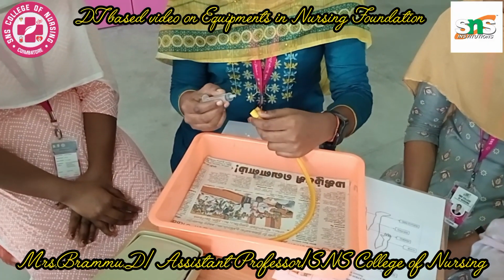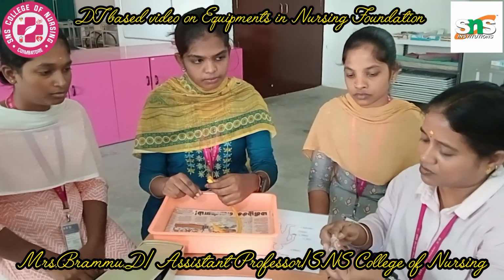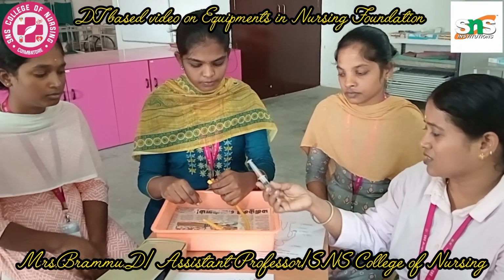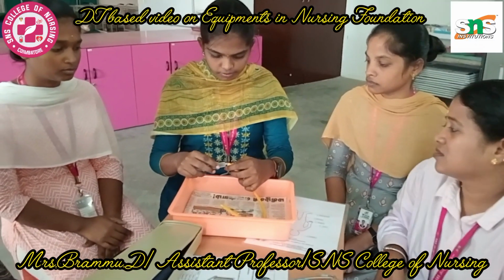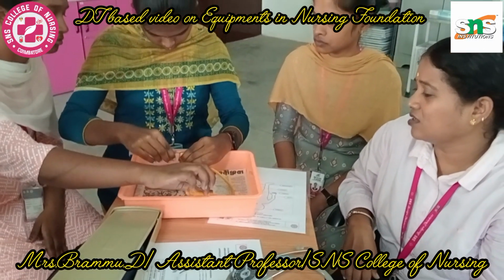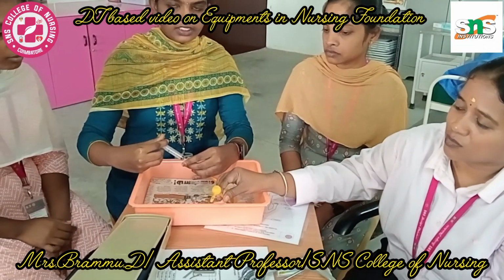So I'm going to inflate using this 5 ml syringe. For demonstrative purposes we are instilling air, but when you catheterize the patient, distilled water is to be used. So just for demonstrative purposes we are using the air. She is attaching to the balloon port, and you can see the balloon getting inflated. So the balloon is inflated.